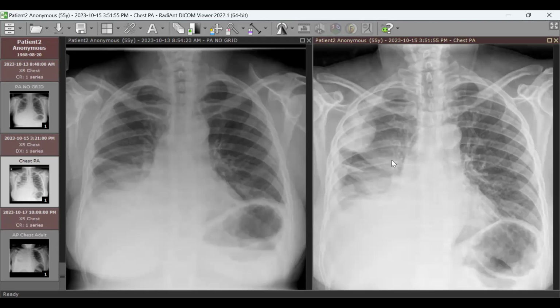The D-shape sign. Yes, it has a wide base on the external side, an obtuse angle with the chest wall or pleura. Here, because it's contrasting with the lung, the border is clear, but here there's an incomplete border sign. Yes, it means an extrapulmonary lesion, either in the pleural cavity or the chest wall. So the patient's condition is worsening.